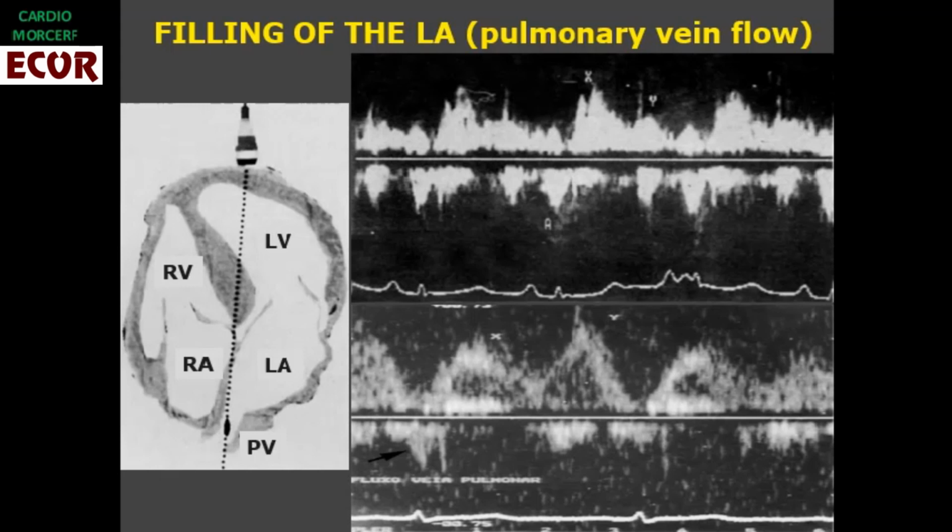There is no way not to include also the vein walls that have velocity like the flow we want to analyze. We cannot use filters or the flow will also be suppressed. The visualization of this reverse A wave is very difficult. At most we can check if the X wave is lower than the Y wave. But this sign is not specific. To be frank, I don't waste my time looking for this kind of flow.